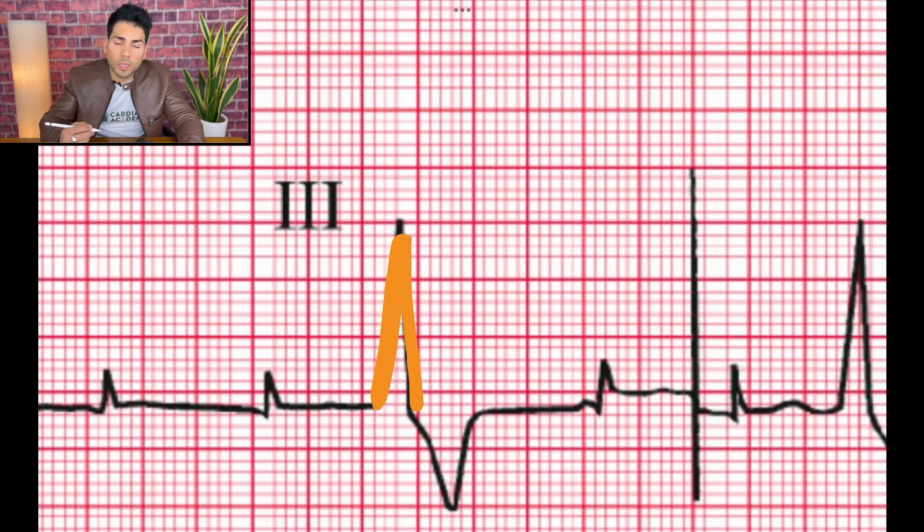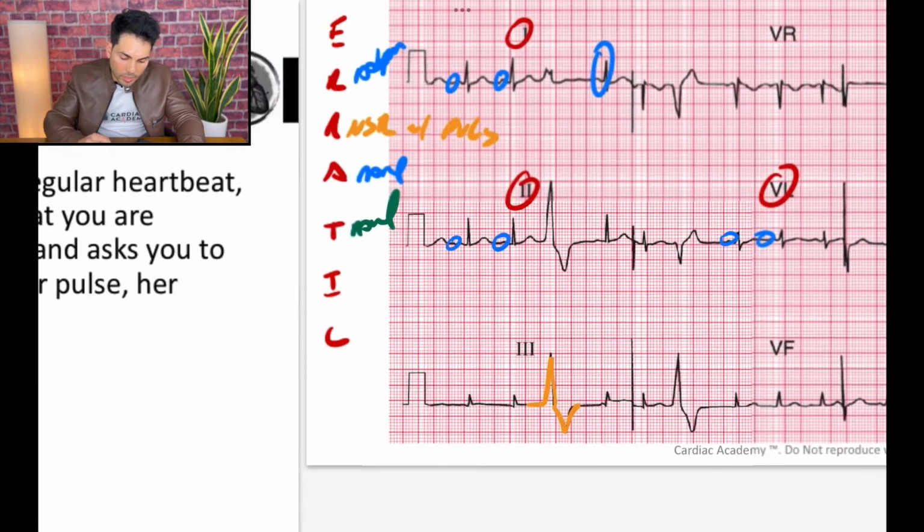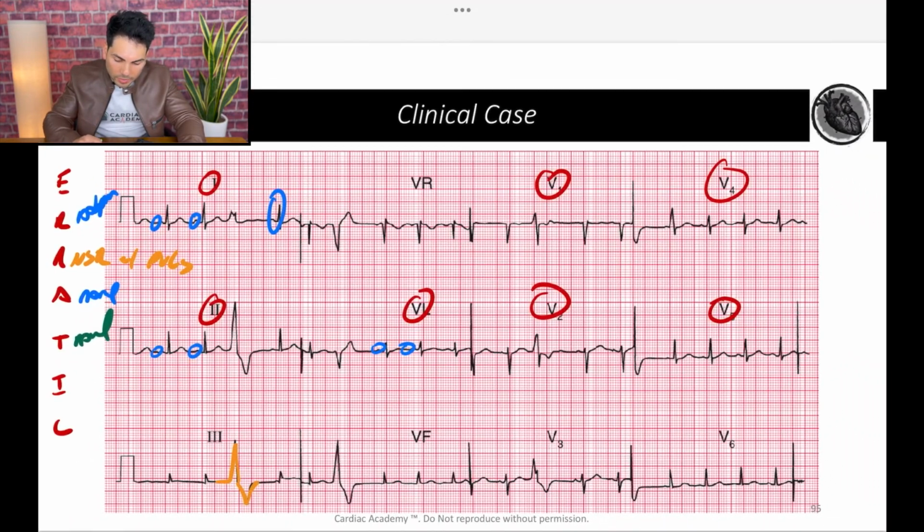And then we see a secondary repolarization abnormality. This does not count as a T wave inversion because it is secondary to the PVC. It's a premature ventricular contraction. On a young lady like the one in this example, it's probably benign, nothing to worry about. There are only a few here and there, so nothing too worrisome.